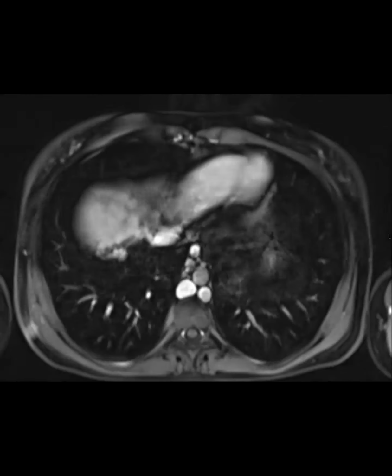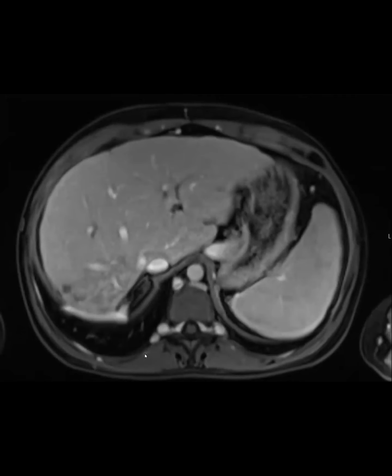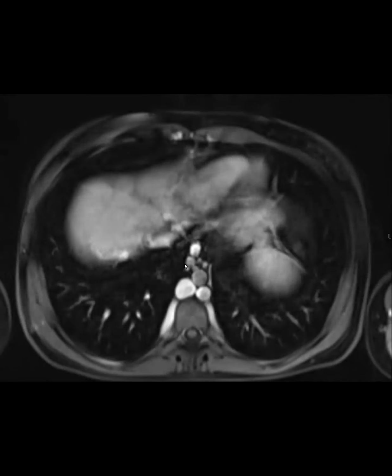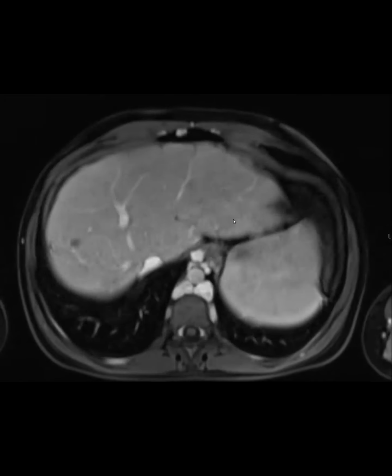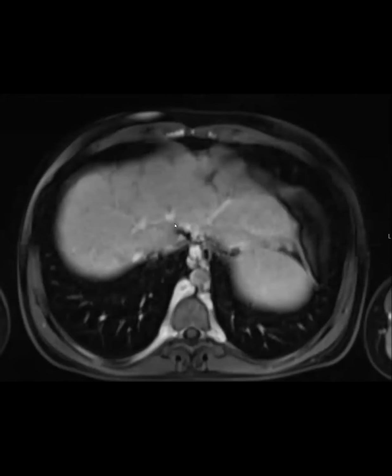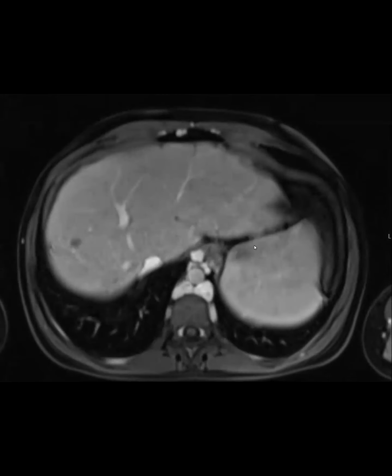Yeah, there's tons of collaterals, right? A little bit, yeah, by the anterior, like segment 2, there's a bunch of little vessels right there, maybe there, or like posterior segment 2. Like here? Yeah. Okay, that's not exactly the area I want you to focus on.